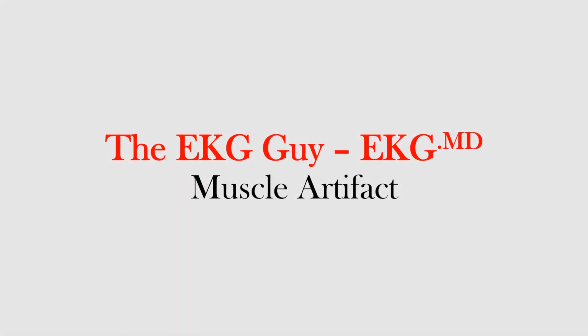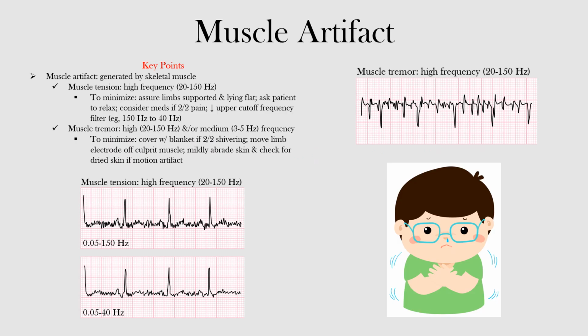In this lecture, we will discuss muscle artifact, including how it comes about, how it appears on the EKG, and how it can be minimized. Muscle artifact is generated by skeletal muscle, just as the name implies, whether it is from muscle tension or from a muscle tremor, as in patients with Parkinson's disease. Okay, you can see that resting tremor.